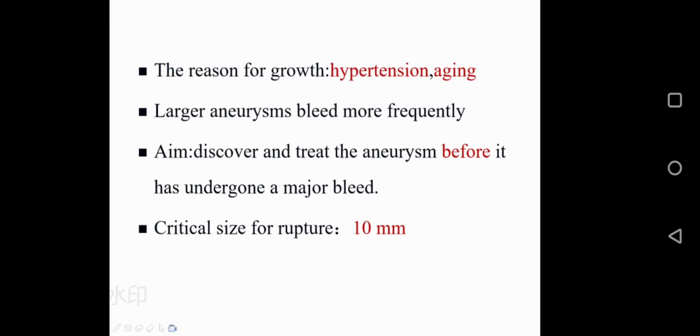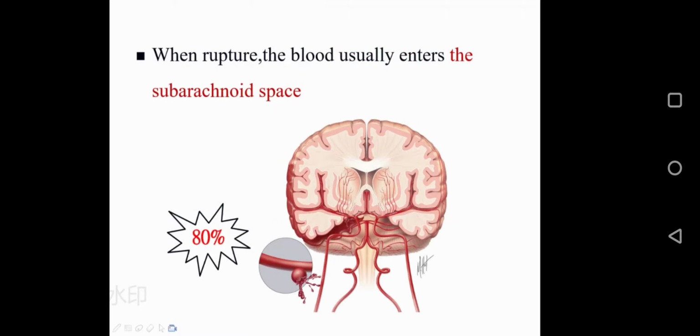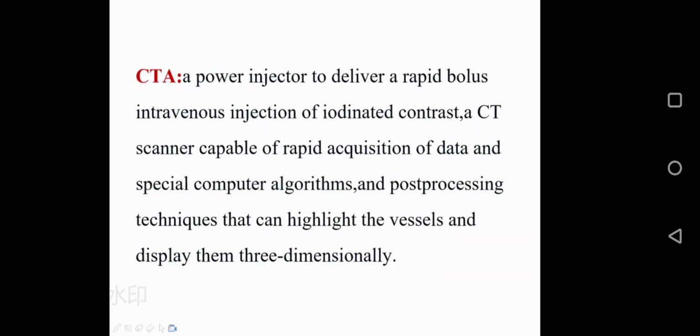Today, most aneurysms are detected by CT angiography and MR angiography. CT angiography is a kind of non-invasive examination using a CT scanner and injection of contrast media, and doing post-processing to show a 3-dimensional picture of the aneurysms. Similar to CT angiography, MR angiography is also a non-invasive examination for a doctor to detect aneurysms, but it can be done without any contrast media. Sometimes we perform MR angiography with intravenous injection of MR contrast media to highlight the blood vessels being studied.